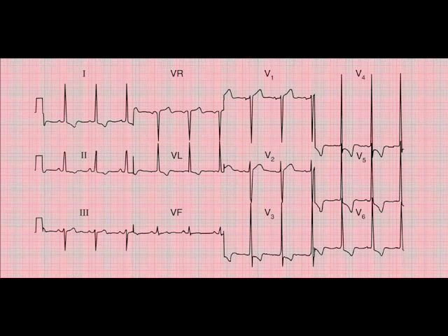This is the final example I'm going to talk you through. Then we need to get you looking at some examples yourself, working through them systematically, and we'll give you some written answers to those.